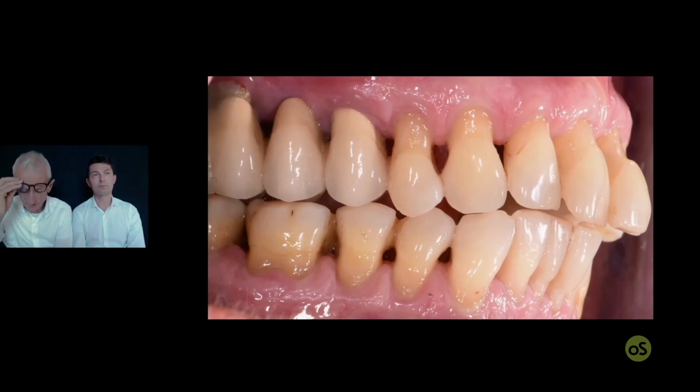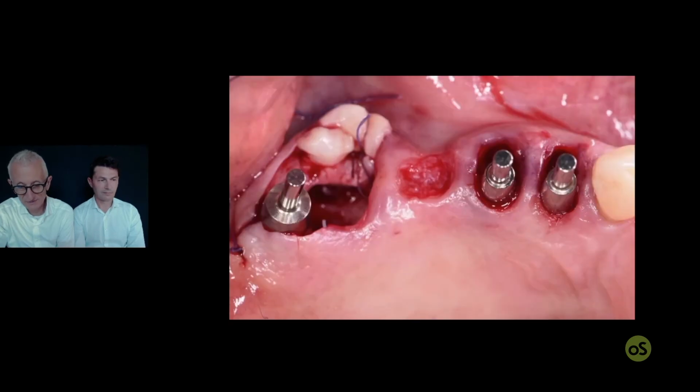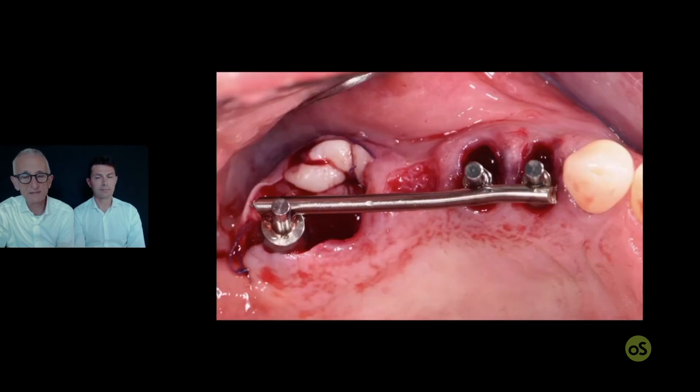So, day of the surgery: teeth extraction, implant placed where there is bone, abutment more or less parallel, as I'm using a straight abutment, cap, and framework made in this way. It is very important to use this wire to give stability to the implant because this increases predictability. Obviously, the dentist can use other material if they want to make a framework. They can use whatever material they want to mill chairside.